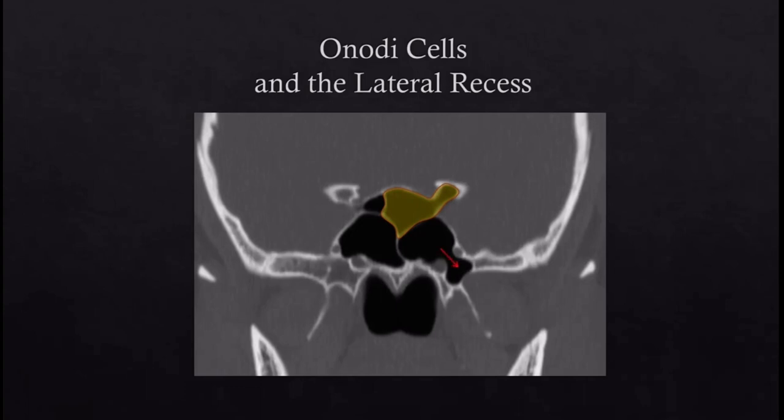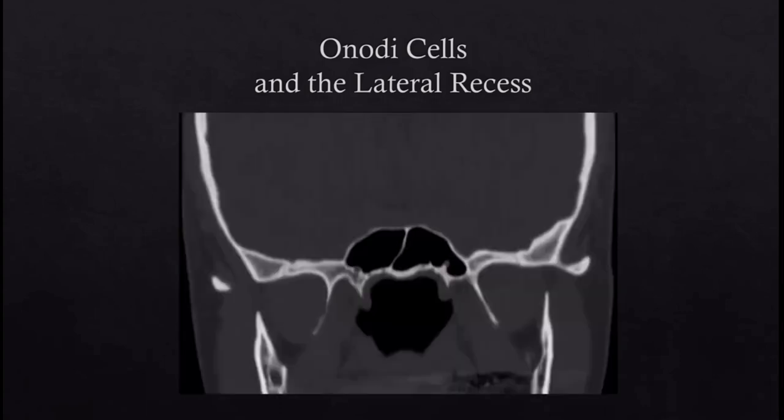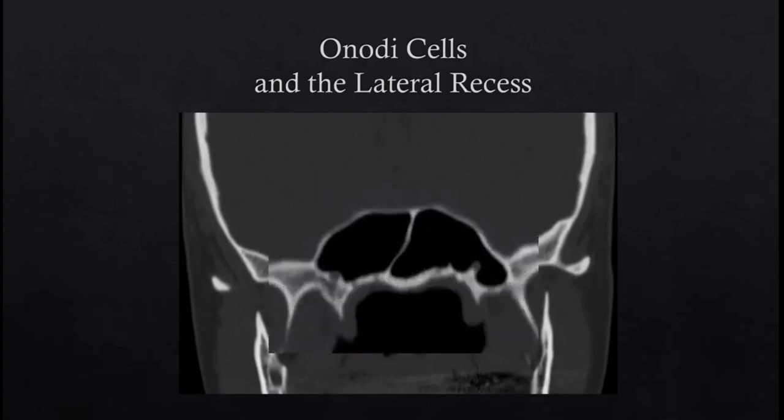You can also see here something called the lateral recess of the sphenoid sinus. It's an outpouching of the sinus that extends between these two round dots here. Above and lateral is the foramen rotundum for the maxillary division of the trigeminal nerve, and below and medial is the Vidian canal, which is making its way to the pterygopalatine fossa. Sometimes these Vidian canals live on little stalks that protrude up into the sphenoid sinus, and they look a little bit like snails, don't they, protruding here. And you can imagine that somebody with an endoscope could quite easily go in and pull those out.